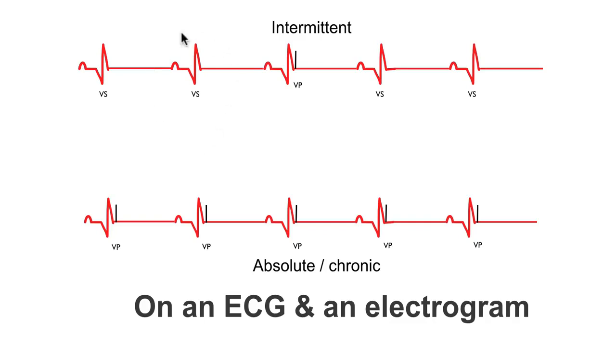The same occurs here. However, on the next heartbeat, we can see that atria depolarizes. This is sensed by the pacemaker. It then starts its AV delay, but this time it hasn't registered that a ventricular depolarization has occurred. So, what does it do? It tries to trigger a depolarization itself. This is what a pacemaker is programmed to do.